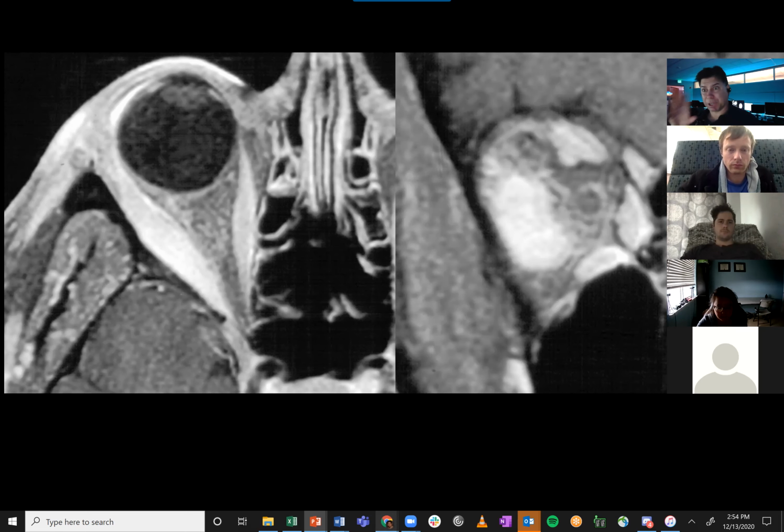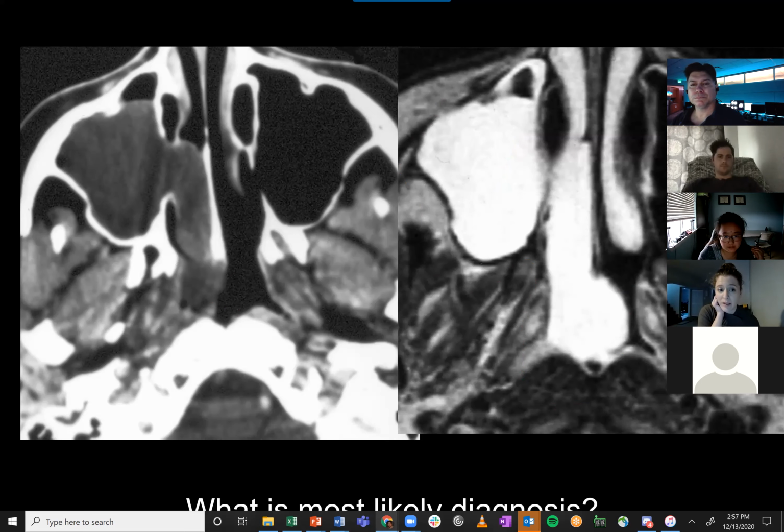So this could be just like a run-of-the-mill sinus disease, maybe an obstructive pattern. Do you often see run-of-the-mill sinus disease with a giant mass that looks like it goes all the way back into the nasopharynx? No. When you look in this guy's mouth, there's two things hanging down in the back. The other thing would be maybe something that's pretty cellular, like a lymphoma potentially.